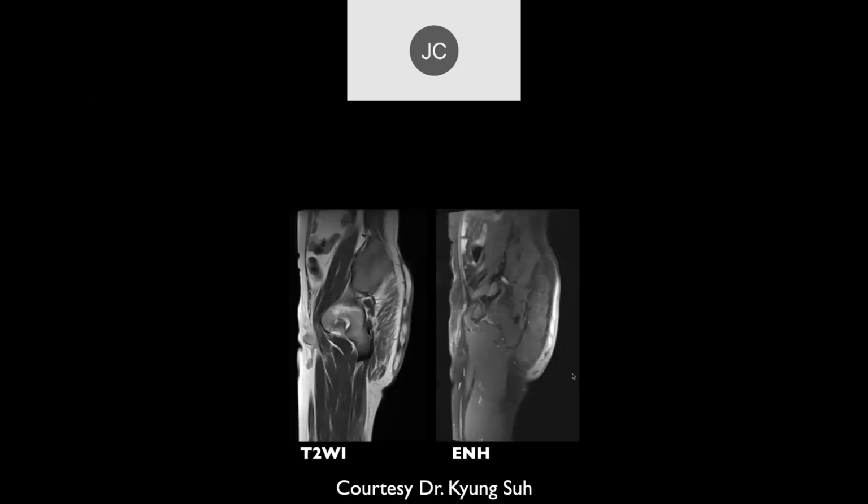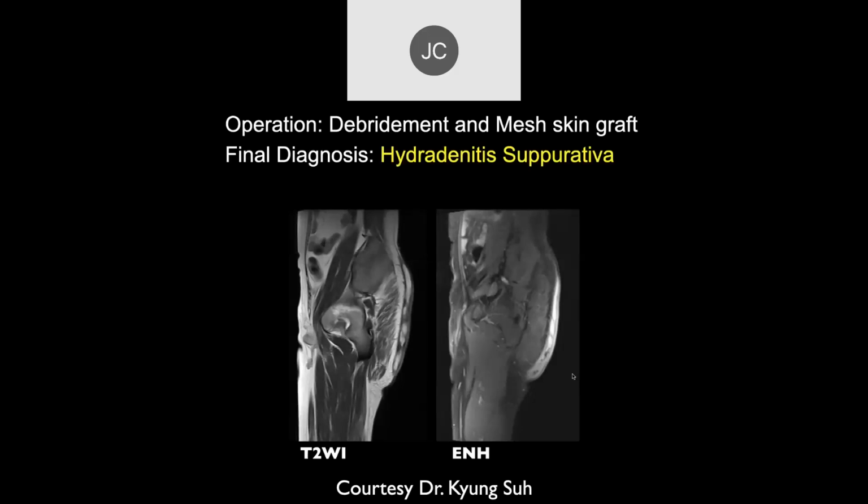So what do you think is going on here? I mean, is it chronic bed sores? Yeah, it's called hidradenitis suppurativa.